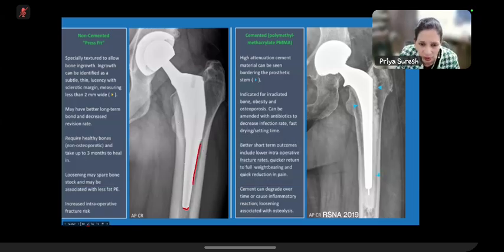So this will be on the post-operative film itself. You should be able to see that, and sometimes it may take 1 or 2 days, but usually they do it a few days post-operatively. And this is only 2 millimeters wide. So this is non-cemented. Okay, and this is cemented. You see the cement? This whole thing is the cement, from here to here. So this is the cemented part. And sometimes they have a stopper so that the cement doesn't leak any further. So you can see the cement here as well.